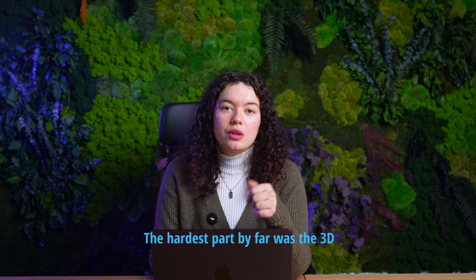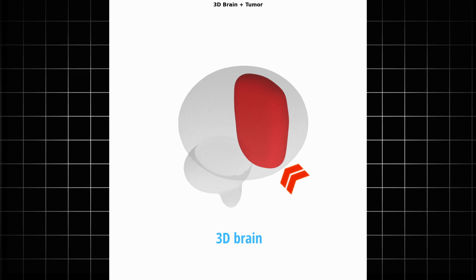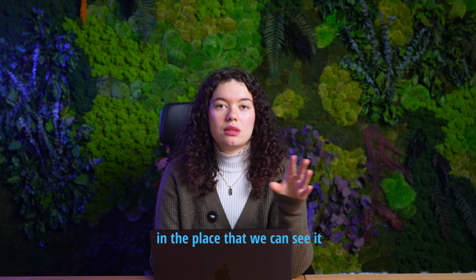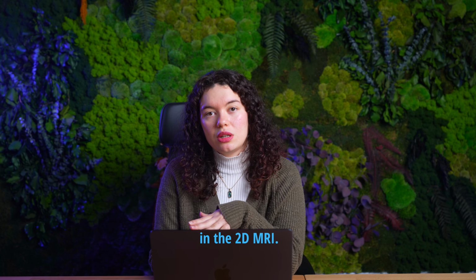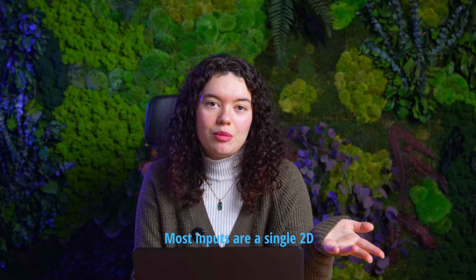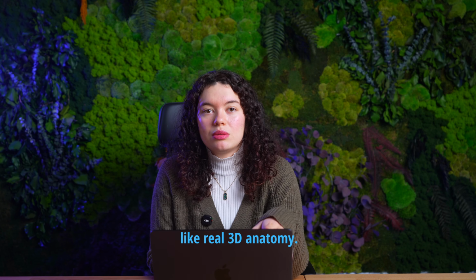The hardest part by far was the 3D visualization, because the goal is simple: show a 3D brain with the tumor placed inside of it, exactly in the place that we can see it in the 2D MRI. But here's the core problem. Most inputs are a single 2D MRI slice, and a single slice cannot really produce real 3D anatomy.